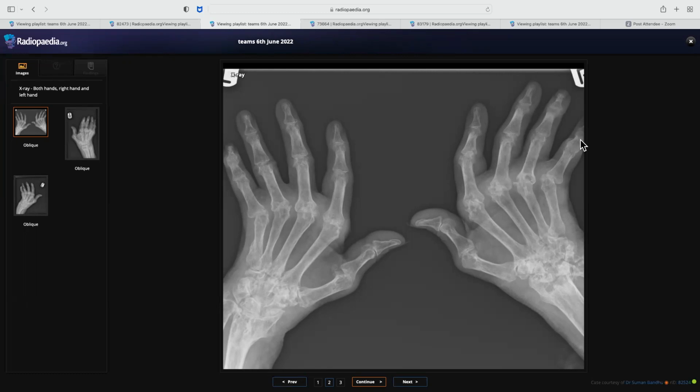Especially in the periarticular regions, what do you say about the bone density? No, I want to take my statement back. The bone density is markedly reduced in the periarticular spaces, and this is symmetrical involvement, and there is some subluxation also.